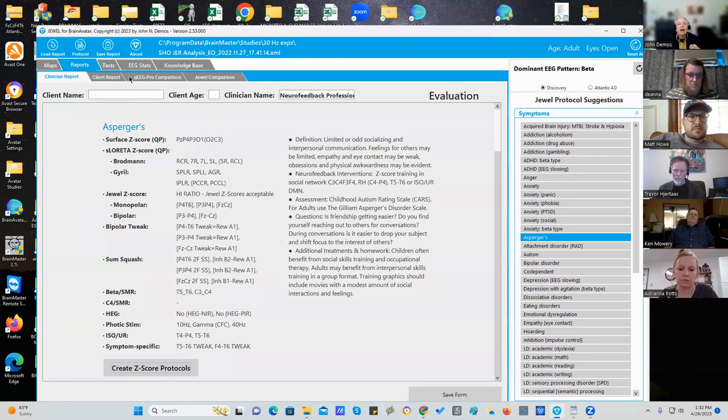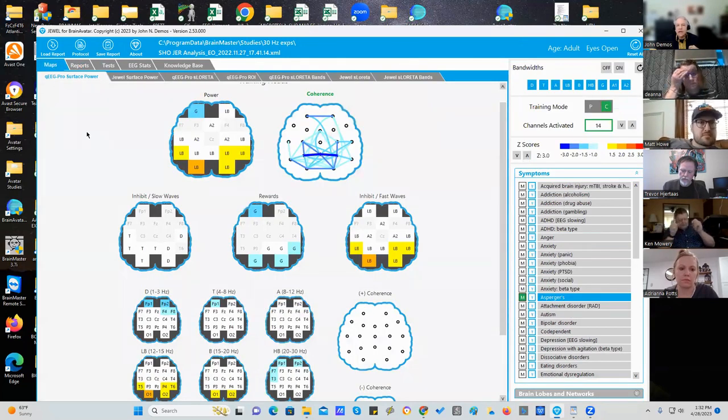So now with experience, we might say, okay, I know that the sites for coherence are much better for this client with Asperger's. So we might, with experience, say, I know that the coherence training is better. But without experience, we can just simply say, where's the gold?